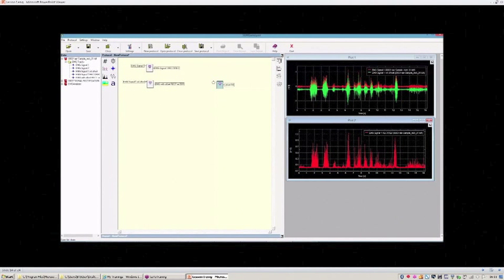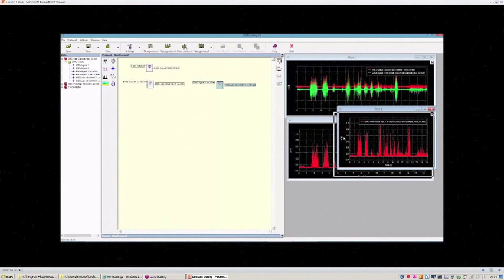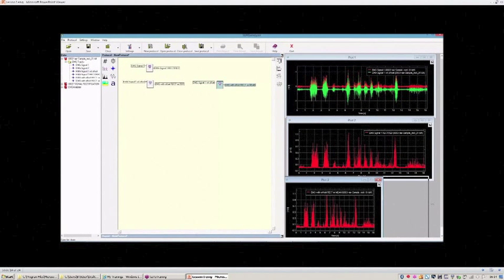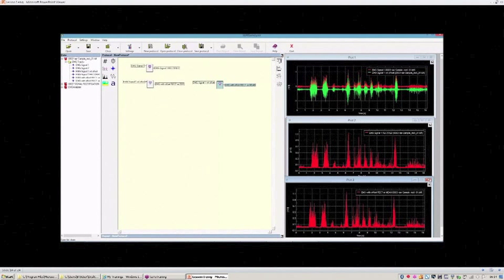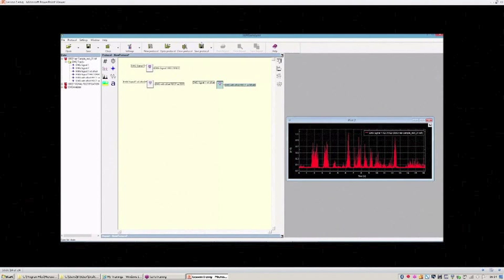Okay, so this is the name of the output. Let me now show you the results. Okay, and so, as you can see now, we have correctly performed the rectification of the signal. So this is just to show you the meaning of the second operator available.